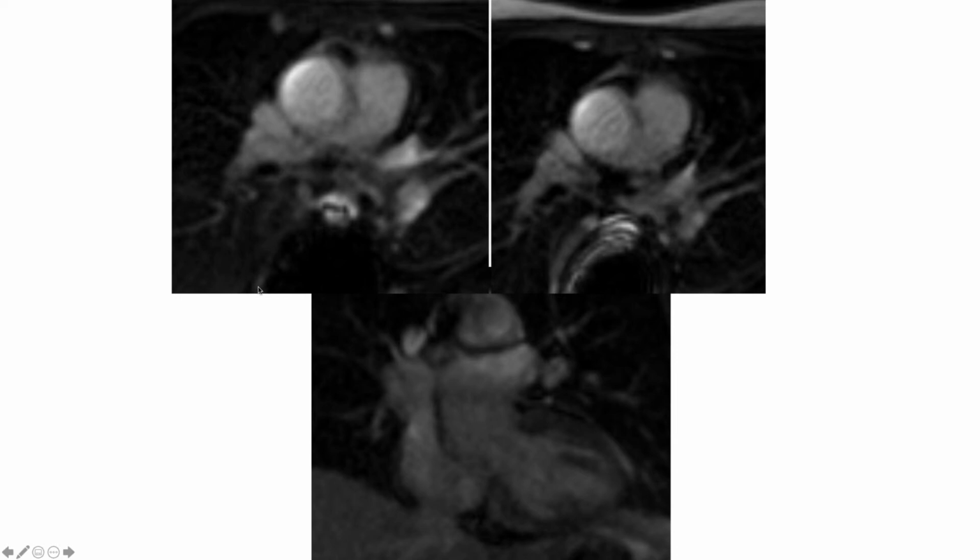So I did a delayed CT just to see if there was enhancement of this mass, and really the myocardium was about 80 Hounsfield units, and this was 69, so no significant enhancement. Just some still images of the CT, some reconstructions depicting this mass.